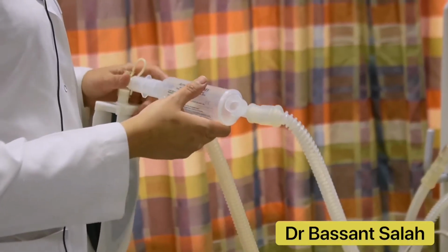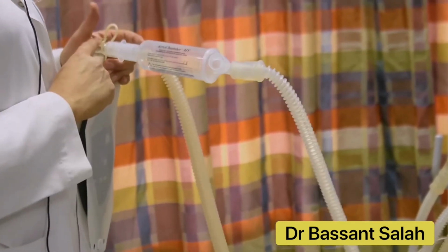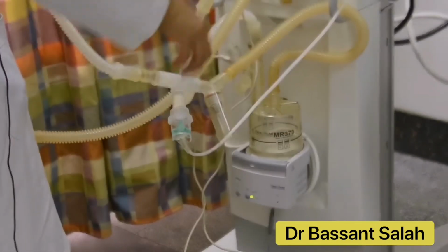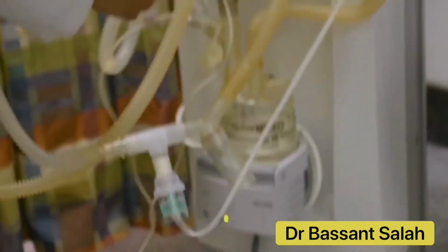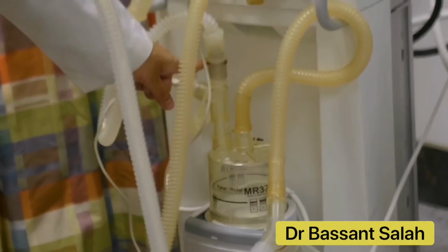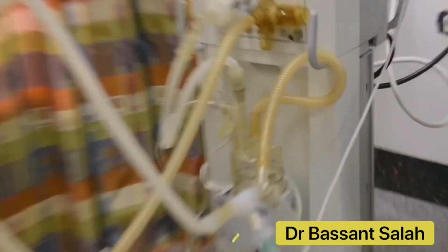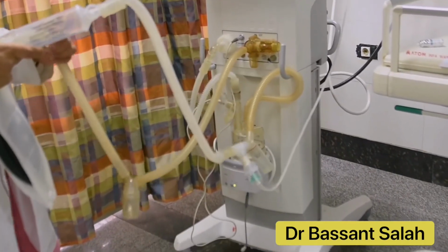So if I choose which position to connect to the patient, position number 1 is about 15 centimeters from the Y-piece. Position number 2 is closer to the ventilator, but after the humidifier. Position number 3, closer to the ventilator, but before the humidifier. Which one is more effective in delivering the medication? Position number 3 is more effective in delivering the medication, as it gives time for the inspiratory limb to act as a reservoir containing the medication before it is wasted to the expiratory limb.